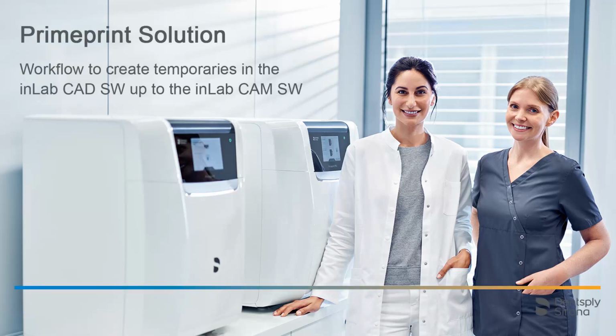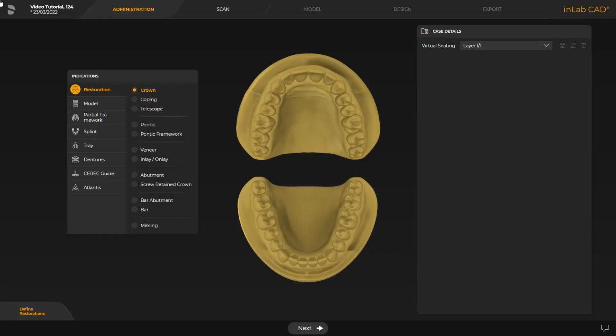Welcome to this video tutorial on the topic of Primeprint Solution. In this video, we will demonstrate the workflow to create temporary crowns. We will guide you through the inLab CAD software to the inLab CAM software. Our case concerns designing 3 temporary front teeth crowns in the upper jaw.